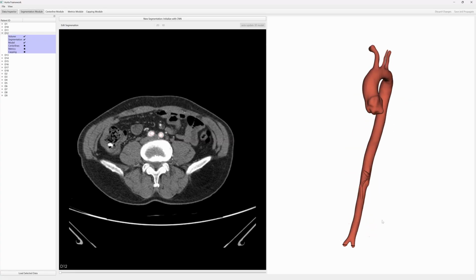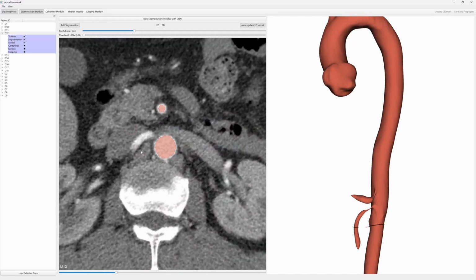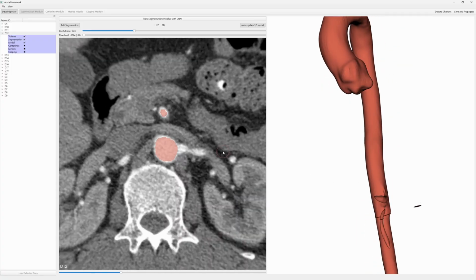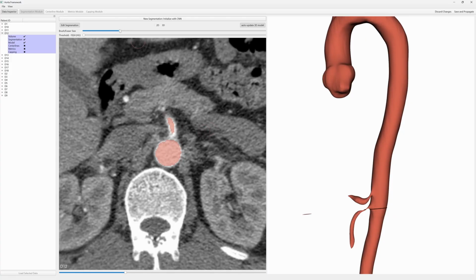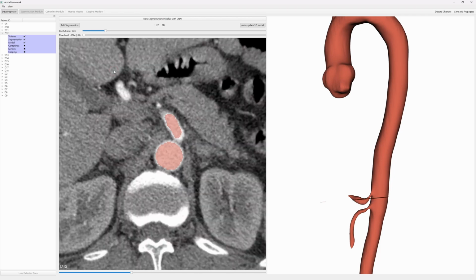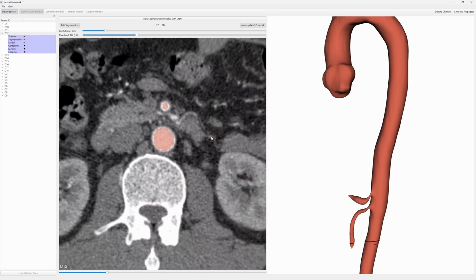If the prediction should not be satisfactory, the editing mode can be used to correct errors by clicking on the slice view. A brush and eraser are provided to assign pixels to the vessel or background. Each can be used as a 2D version for precise editing of individual slices and a 3D version for quick segmentation of larger areas. A Hounsfield unit threshold is available to further accelerate the correction.